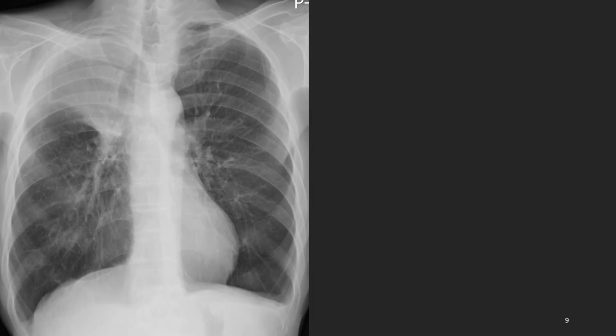We already have learned many things about chest radiographs. First, lobar anatomy in session 2 and silhouette sign in session 6. And we also learned lobar anatomy in lobar pneumonia in session 11. So this will be easy, not difficult for you and me. Let's just begin. This is the first case of right upper lobe collapse. What do you see?